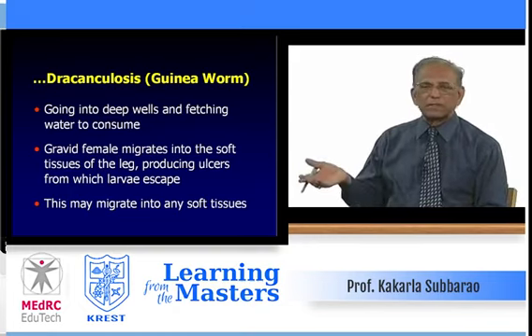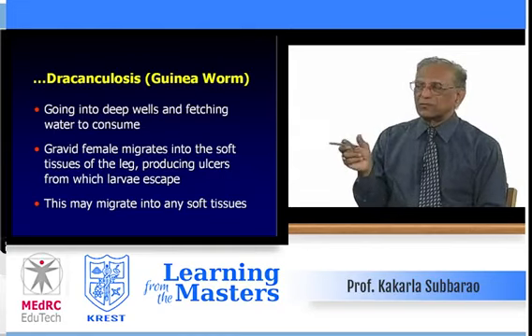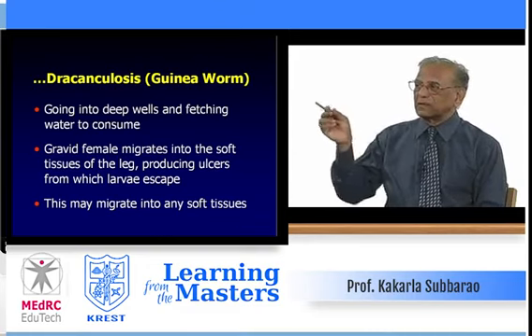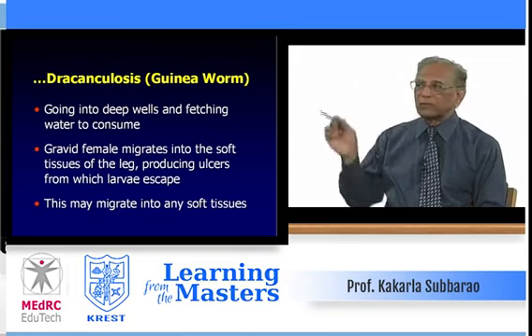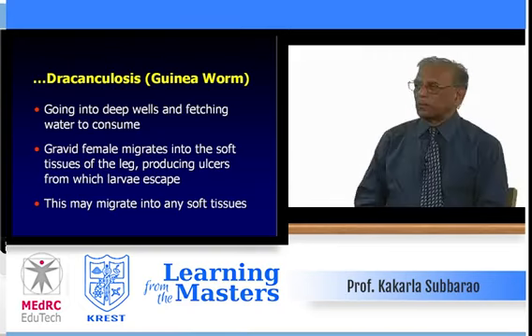But radiological interest is, active guinea-worm you can't diagnose. Through the ulcer you may clinically see it. But calcified guinea-worm, in fact, the film on your left side, somebody suggested old tuberculosis. But then if you take a lateral film, that is in the back soft tissues, you can see the coiled calcified worm, which is classical of a guinea worm. It is not cysticercosis. Cysticercosis shows a cigar-shaped or a cylindrical type of density.